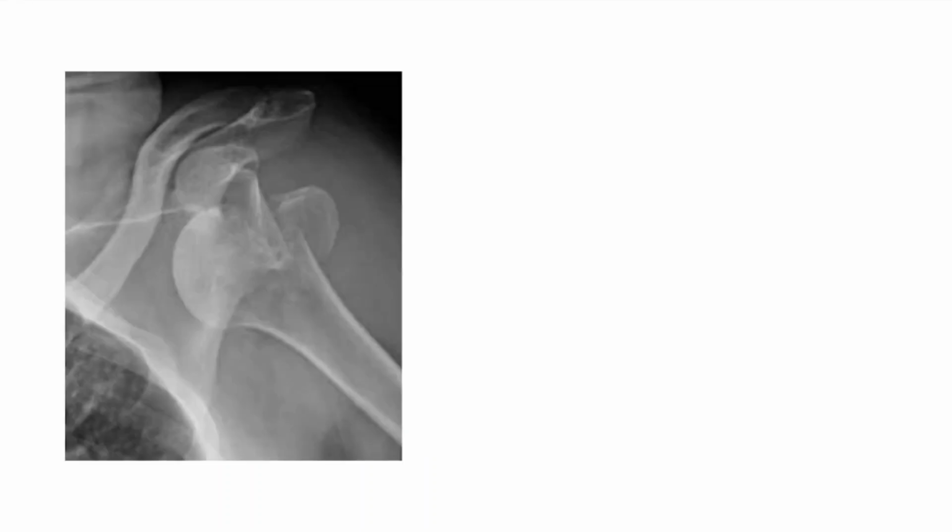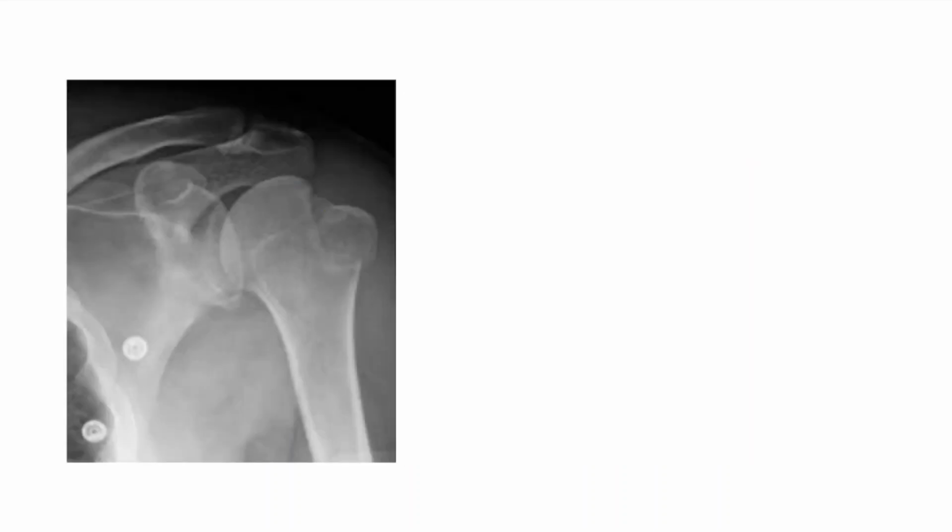Now what does this picture show? This shows humeral head fracture dislocation. This is the same thing after reduction.